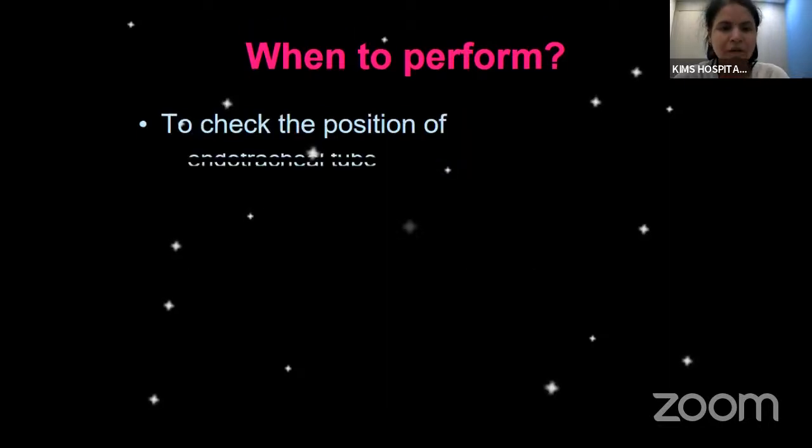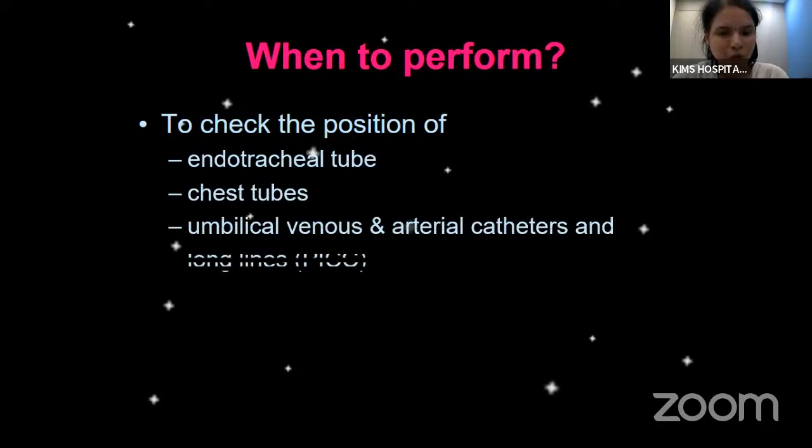Likewise, an X-ray may have to be performed in order to check the position of devices such as an endotracheal tube, chest tubes when placed freshly. When a baby has an accidental extubation, it is sufficient if you just note down the position at which the tube was earlier fixed, provided it was in right position. The same position, it can be refixed, and every time the infant is reintubated, a repeat X-ray is not indicated for checking the tube position. But the first time, it is ideal to get an X-ray for checking the position of the ET tube.